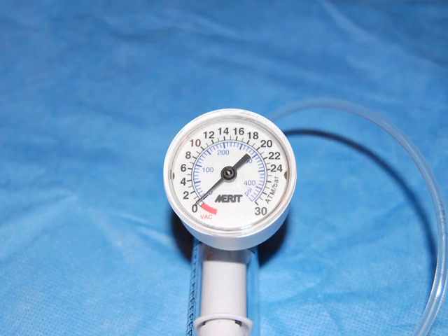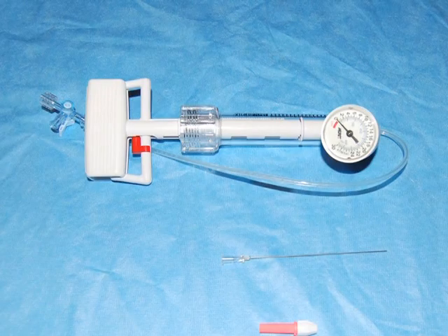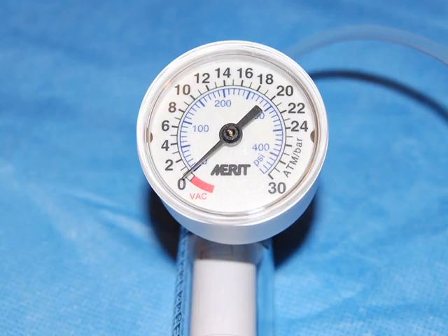The angioplasty balloon is inflated with an indeflator device which provides atmospheres of pressure to inflate the small balloon. This is delivered through the manometer, which is filled with a mixture of contrast material and saline, and delivered up to atmospheres ranging from 1 to 2 atmospheres all the way up to 20 to 22 atmospheres of pressure. This is easy to see visibly and is designed for quick inflation and quick deflation.